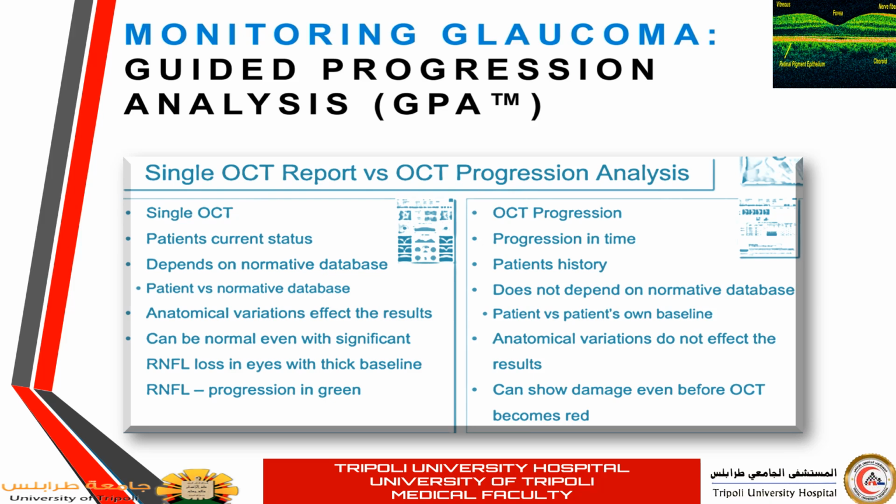And it depends on what type of analysis you are going to apply to this data. The event analysis means that you analyze a particular area or point in the visual field or in the OCT over a period of time. However, in the trend analysis, you assess the findings globally over a period of time, and you can even predict the future of your patients.